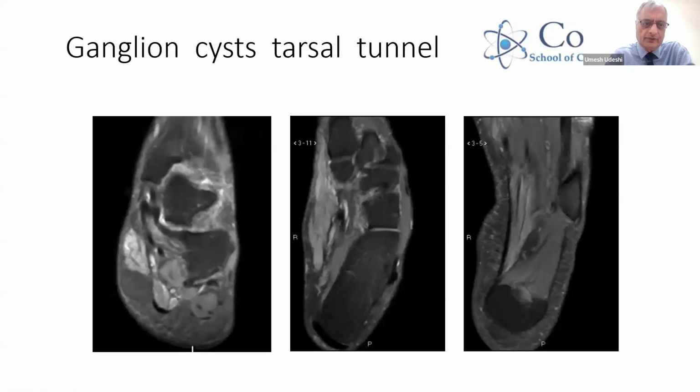And this may give you denervation edema in the muscles that are supplied by any nerves that are impinged on. So here, this is a normal muscle appearance on fat suppressed images. So that muscle is normal, that muscle is normal, but this one here and this one here are showing edema. And then on the actual image, here's a muscle showing edema compared to that deeper muscle there.